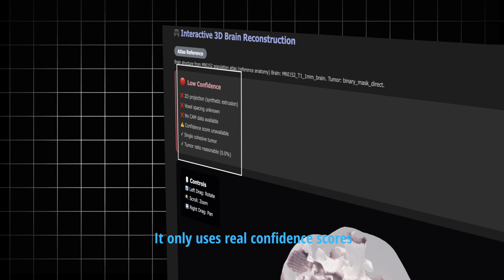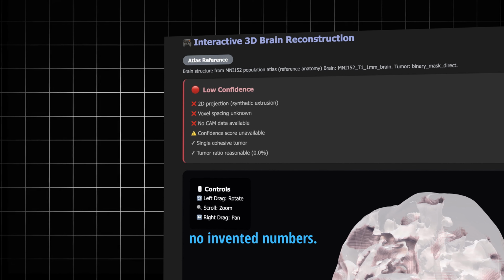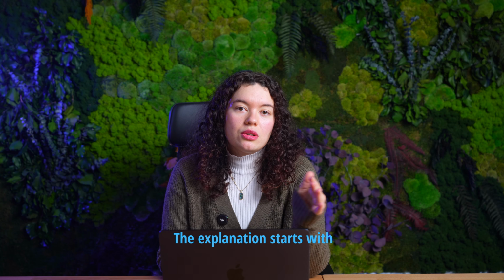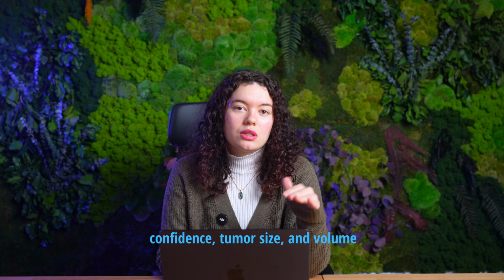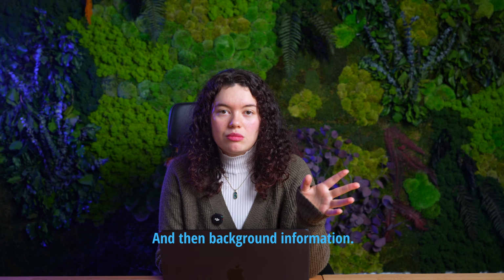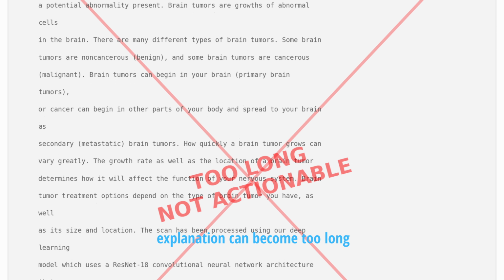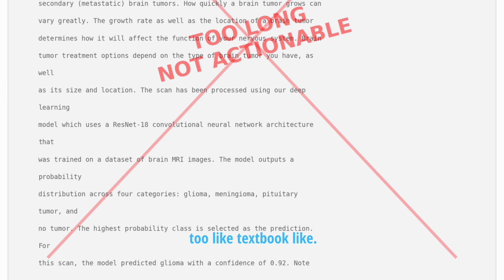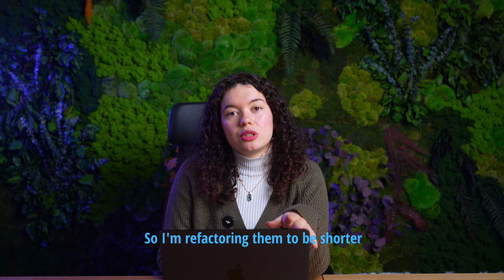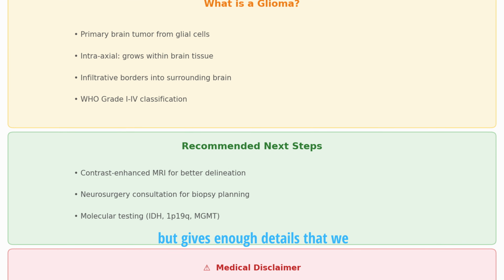It only uses real confidence scores and real tumor metrics computed by the pipeline, no invented numbers. The explanation starts with the predicted diagnosis, confidence, tumor size and volume, only if reliable, and then background information. One thing I'm still actively fixing: explanations can become too long and generic, too textbook-like. So I'm refactoring them to be shorter, more scan-specific, and more grounded, but still give enough detail.